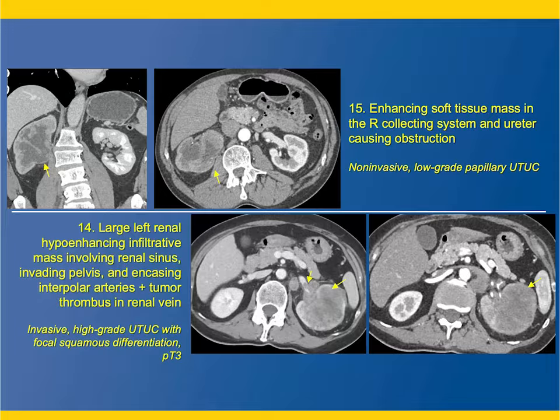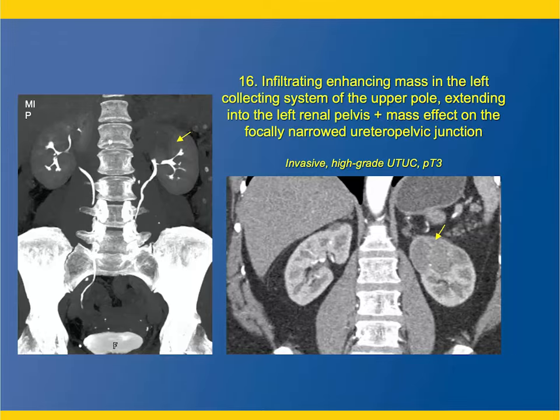I have to admit, the lower case, I would have looked at this and said this could be an infiltrating lymphoma. It's a really nice example for lymphoma. There's renal vein involvement. It can be a classic renal cell carcinoma, maybe a papillary type with infiltration, but these also were transitional cell carcinomas. So I'm showing you some examples of not the most typical appearance, but an appearance you need to be paying attention to. Now we talk about amputation.